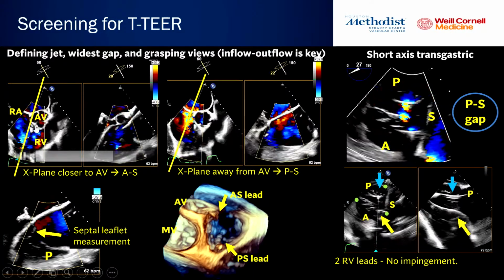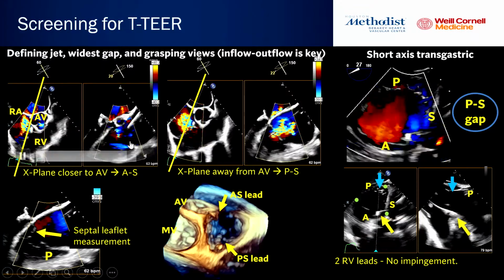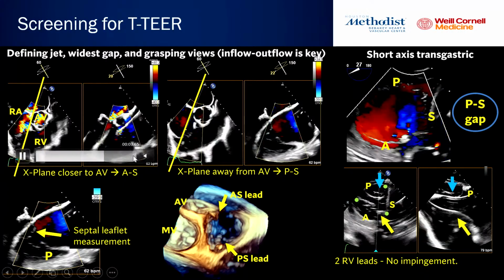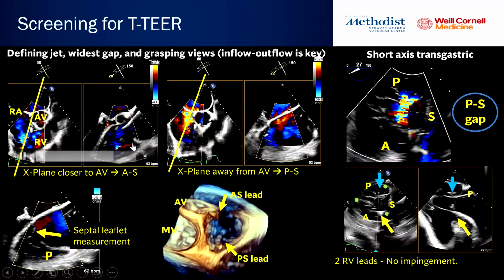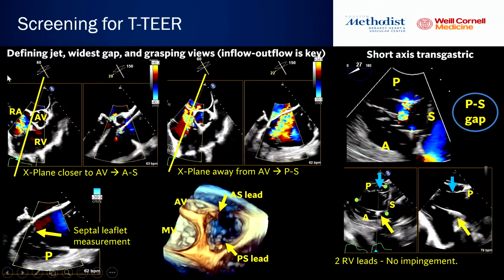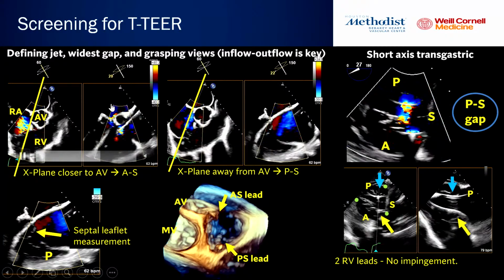So that's going to give me an anterior, this is septal and an anterior leaflet. We also say sometimes, especially when we're doing dedicated views of these, we can call this leaflet the lateral leaflet, which we sometimes don't know if it's anterior or posterior. But in this case, we know it is anterior because we're crossing very close to the aortic valve.